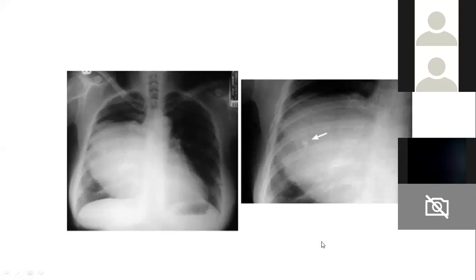What is this? Where do you localize the lesion to? First thing is intrapulmonary or extrapulmonary. Once it is extrapulmonary, that means mediastinal, right? So it's simple. It's silhouetting the cardia, so it's the anterior mediastinal mass. And there are some calcifications.